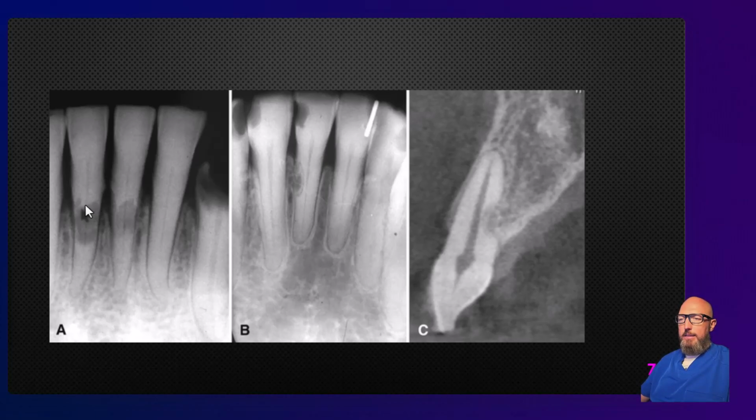In these cases, how can I tell this is coming from external and it's not internal resorption? Well, internal resorption is going to occur from the pulp space or the canal space, and that canal is intact and normal. So these are occurring either from the buccal or lingual, and always good when you can have a 3D view. Now we have a cross-sectional view of, this looks like a central incisor, and the bone looks pretty normal. It's just kind of growing in. Sometimes we call that replacement resorption. Normal intact PDL space. And so this is external resorption on the lingual surface of the root of that tooth.